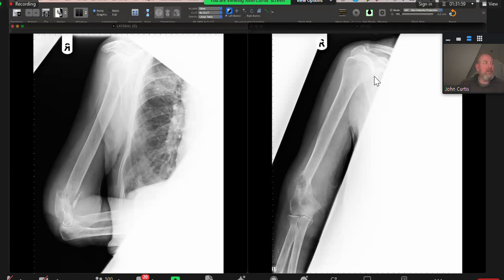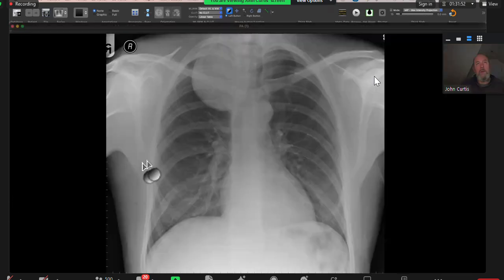Okay, so that was good. In no particular order, that was a schwannoma of the thorax. So it's a posterior mediastinal mass. It's sharp above the clavicle, which means it's not arising from the anterior mediastinum. Even though it's in the middle or posterior mediastinum, it's still large enough to cause tracheal shift. Always worth mentioning that in the exam.